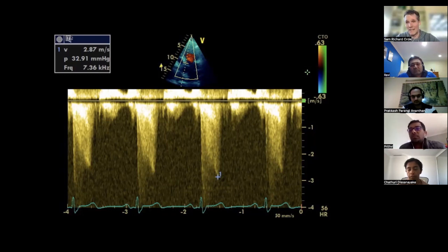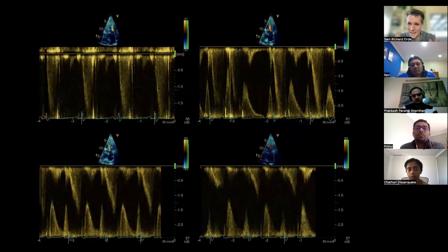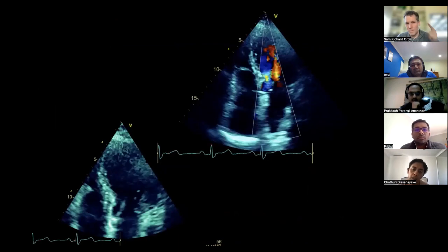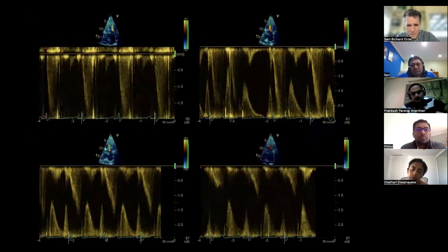You've got an anteriorly directed jet, so you'd pick up both. What's a bit weird is that they're both together, and you actually correctly got that there's potentially a bit of aortic stenosis in there. Then we've got to be talking about where the gradient is. Again, I had to pull that from you a bit, but you got there, which is about the hypovolemia. That's what these traces are meant to show: some form of LVOT obstruction, because you've got aliasing just as you picked up. But as we scroll back with the pulse wave Doppler, meant to be in the mid-ventricle, we've still got a gradient in there, suggesting signs of hypovolemia as well as LVOT obstruction. So just be wary of picking things up on the first image to then get it through onto the next one. But I think it would have been a pass.